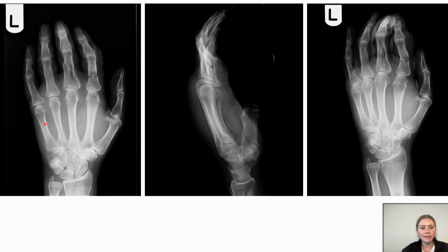Don't see any significant fractures of the metacarpals on any of the views, and the alignment looks good. And so we move on to the carpal bones. Our 4As, so the arcs look good. The angles of the distal radius have that radial inclination and volar tilt, as would be expected. And the articulation between all of the carpal bones is approximately 1 to 2 millimeters. And the alignment on the lateral view does appear to be good, with the lunate and the capitate sitting nicely in that line.